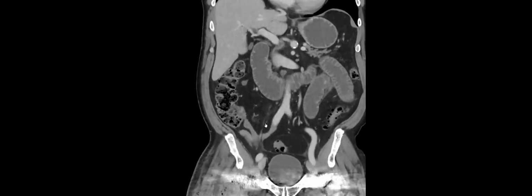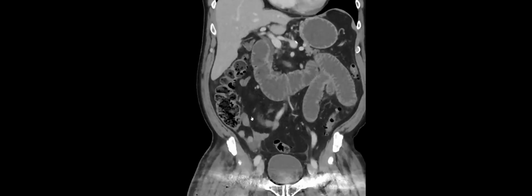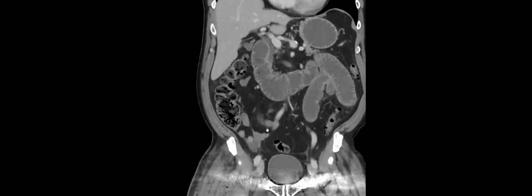So this is a middle-aged person who comes with acute abdomen. We see that the bowel loops are dilated, and we see this segment of blind-ending loop of bowel which has undergone torsion. This loop twists, and it has some mass within. So basically this was Meckel's diverticulum, which had undergone torsion, and the reason was that it had a mass inside, and that mass was GIST. Oh, wow.